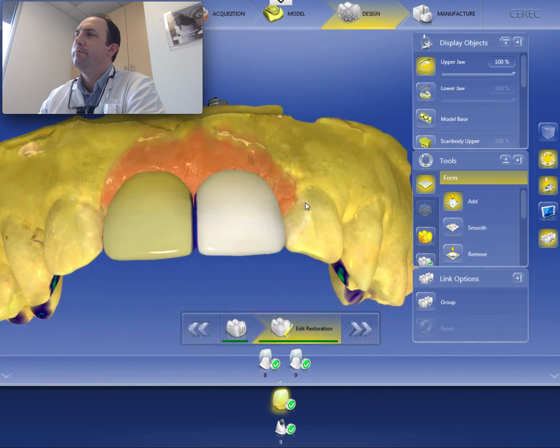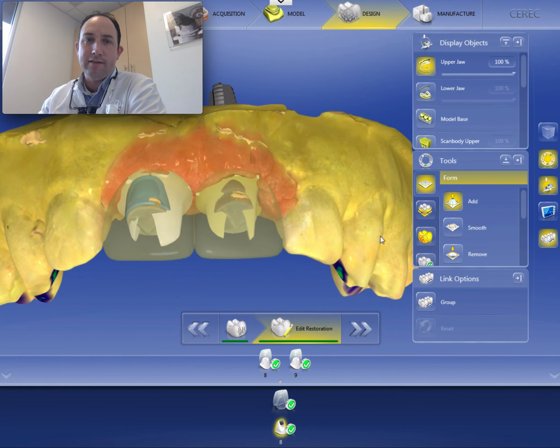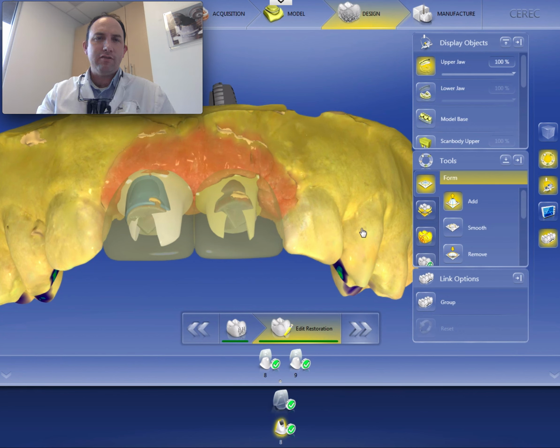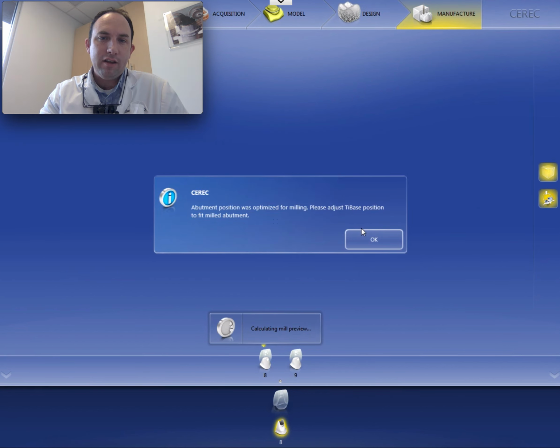Okay. All right, let's get these loaded and designed, or loaded and milling. Thanks for putting up with me. This has been a long video. Yeah, these are challenging, but as long as you've got some experience and can manage the technical nuance, they usually turn out to be just fine.